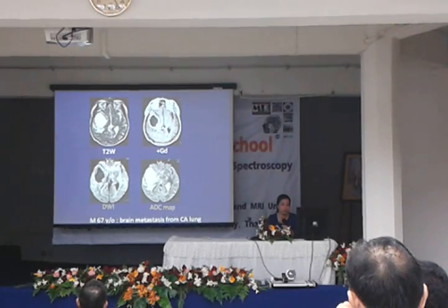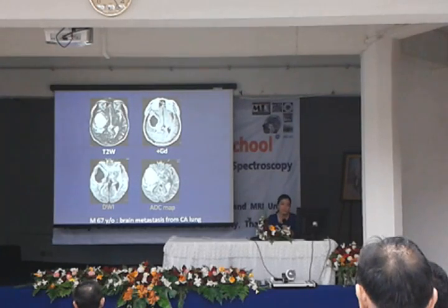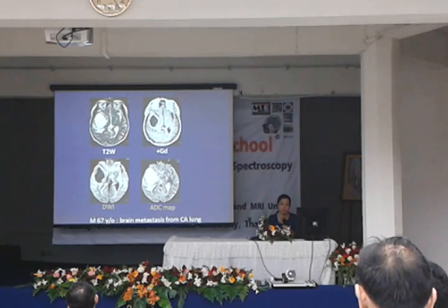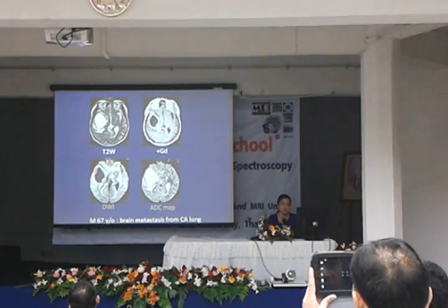And this one can be a lesion that's spreading from cancer from the lung. This one, brain metastasis.